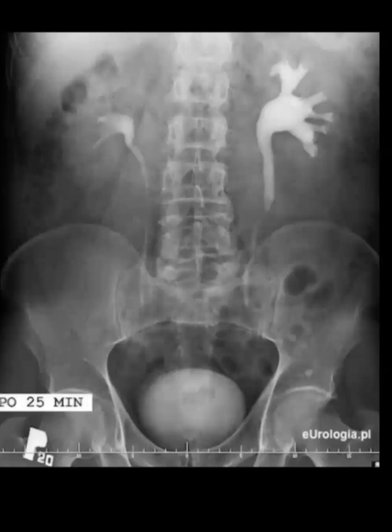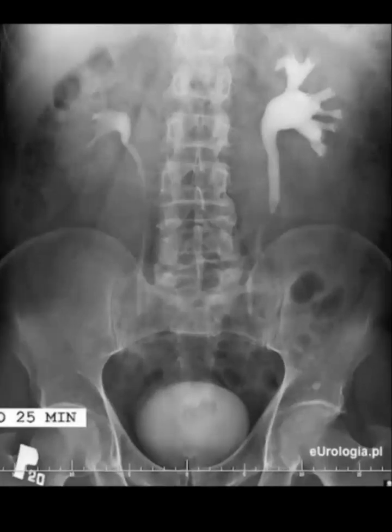This is another example. Some slides are not quite good, but we want to grasp the concept. Here the obstruction level looks clearer. Can you tell me here?